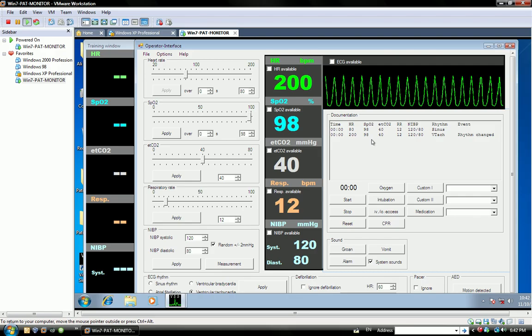If the rhythm is low, then the alarm will be low priority or even medium priority. If the heart rate is a bit fast, it will still be medium priority. If the heart rate is trending to a fast rhythm, then it will be transitioning.